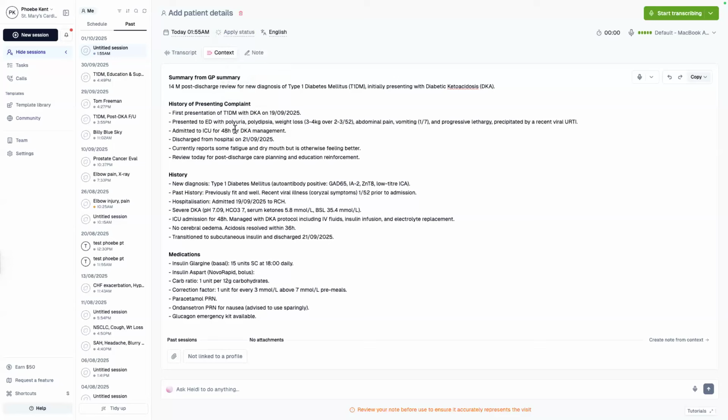What we found was that it was a common issue in really high, fast-paced clinics where maybe you've generated the note but haven't had time to review it. You're moving immediately into another room or having patients come in and out. You wanted a way to flag to colleagues who might be using that note for context that you've not had a chance to review it. So it's just an additional communication tool that some people use. If you review your notes before your patient leaves the room or immediately after, it may be less helpful, but if you're coming back to something and your colleague might jump in and use it, that is ultimately what it's for. Yeah, it's a great safety tool.